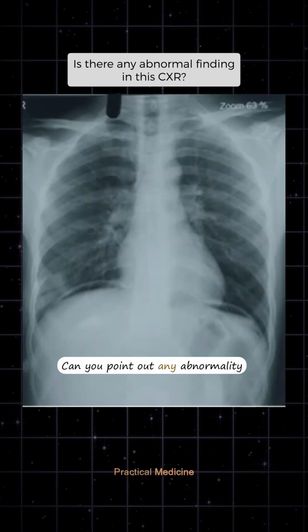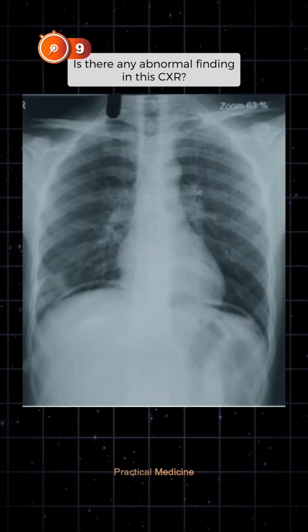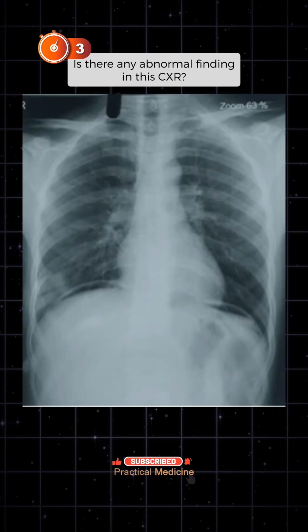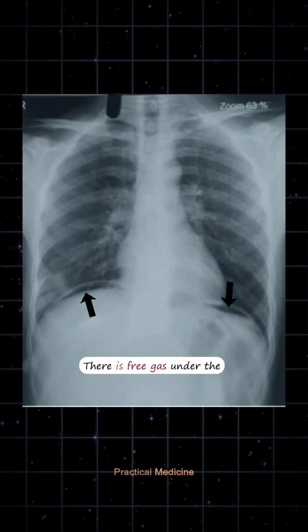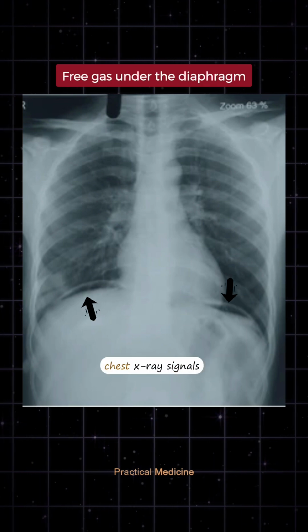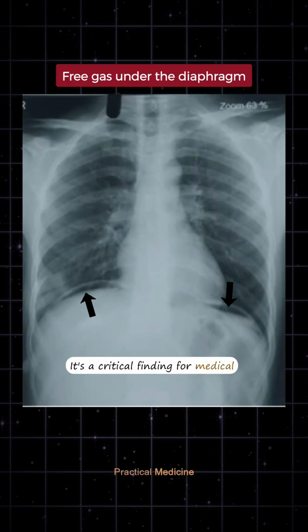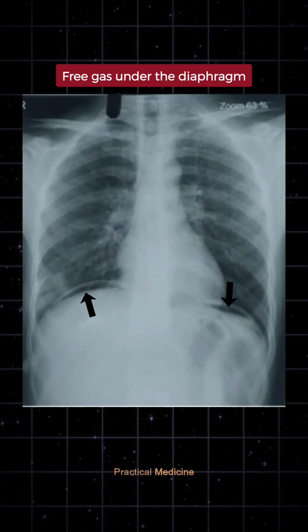Can you point out any abnormalities in this chest radiograph? There is free gas under the diaphragm. Free gas under the diaphragm on a chest X-ray signals pneumoperitoneum, often from bowel perforation. It's a critical finding for medical students to spot quickly, as it demands urgent surgical evaluation.